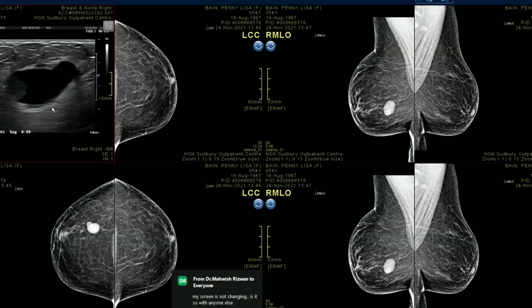If you're not sure, like this one, I'm not that sure, is it going to be a cancer or is it not going to be? I could put it into A or B, it doesn't matter, but don't put it into C. This you would not put into C, okay? So then there's another one, just quickly see, another case I heard.